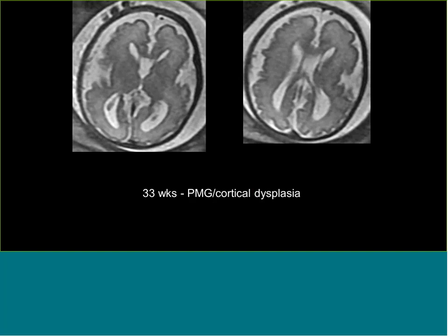But look at the same patient 12 weeks later, and now that gyrification has occurred, we see that this is a totally abnormal pattern. So this child did develop extensive abnormalities of cortical development, which could not be assessed at 21, 22 weeks gestation because this gyrification has not started yet. So this is one of the limitations we have when we do these early third trimester images, that the sulcation has not occurred yet. So this is extensive. There are too many gyri here compared to what I've shown you. And this is what we find in polymicrogyria or cortical dysplasia, and pretty much everywhere along the surfaces of the brain, there are too many gyri.